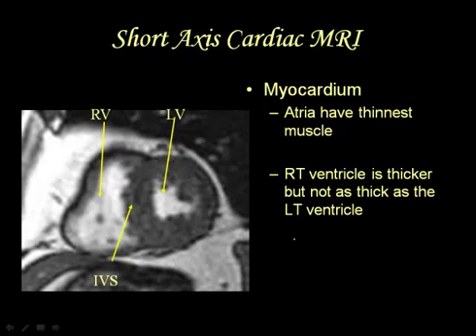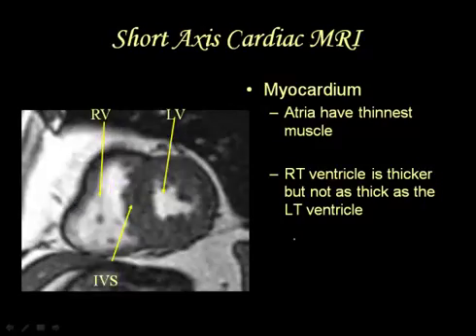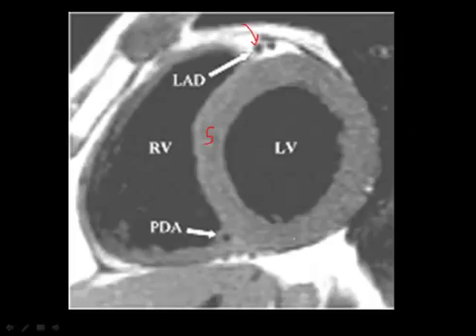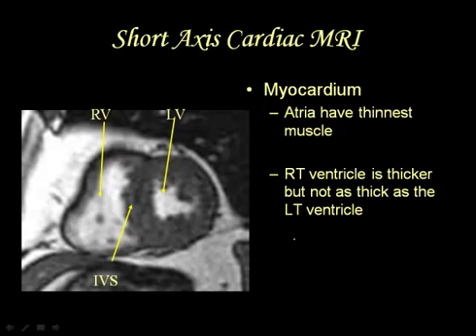One of the things I think I need to point out is that MRI images are acquired using what they call different sequences. The sequences are related to the time of acquisition and to whatever point in the spin of the hydrogen atoms. You can have situations like this where blood is showing up as bright. You can have other situations like this where blood is showing up as dark. This has nothing to do with contrast media. This is simply the way that the MRIs are acquired.